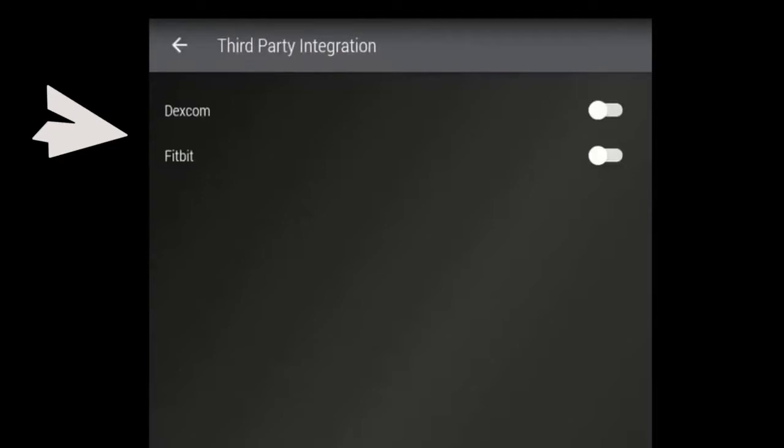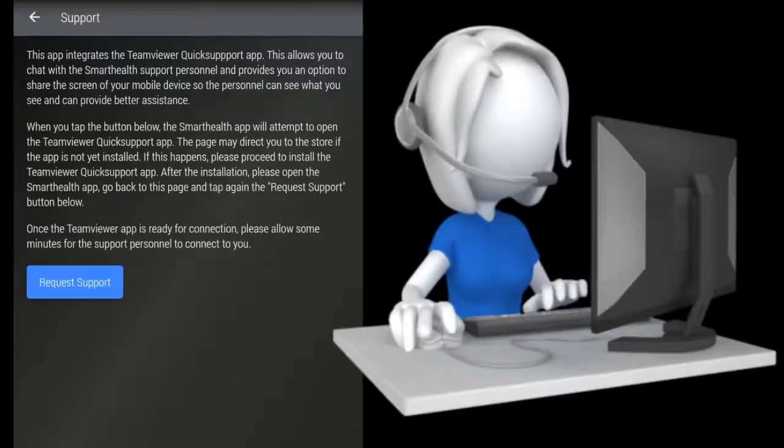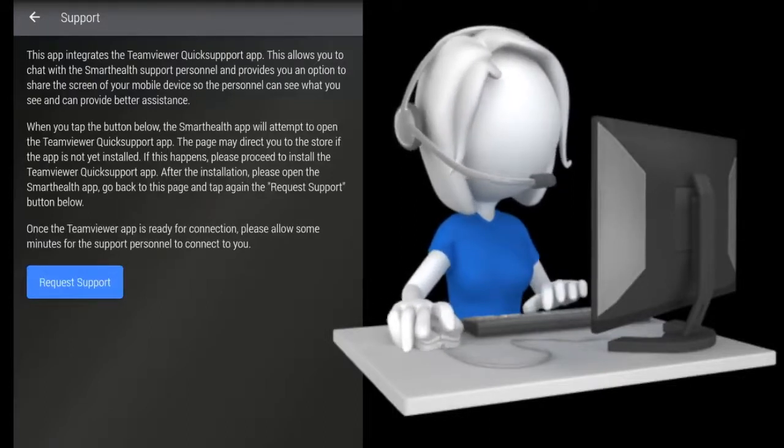Also included in our app is online support created that will eliminate any confusion during the learning curve. The user simply clicks on Options and selects Support. Our support center can educate the user or troubleshoot the problem verbally or use our popular screen sharing technology, giving our support center the access to view what the patient is seeing and also giving us the capability of taking over control of the screen and showing the user what to do.